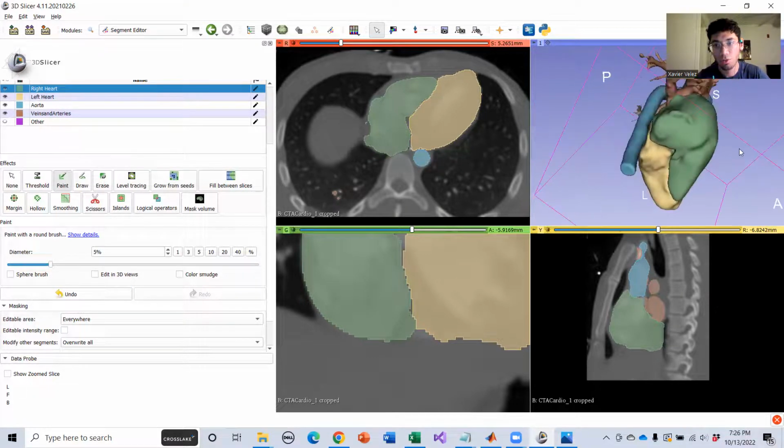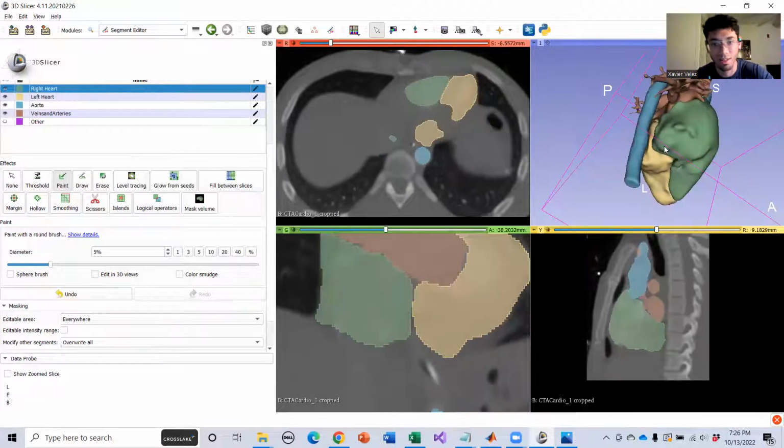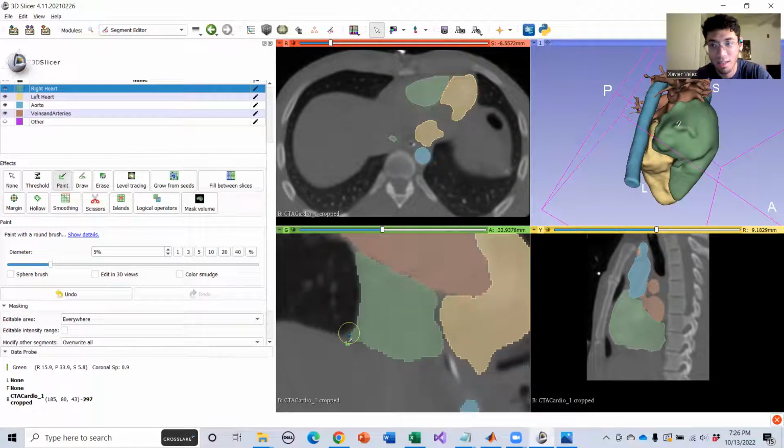You know what? This is so ugly. I should have started here. I don't know what the heck that is. Get out of there. Is that this?